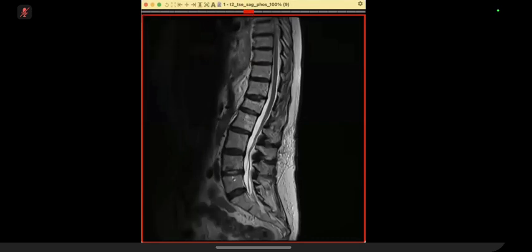I'm worried also about this disc, doctor, because of this abnormal high signal. I'm worried this disc maybe there is some sort of discitis. So I like to review this disc in the T1 weighted images, and if there is a contrast, I like also to see if there is an abnormal enhancement. Okay, I'm checking. Leave the mouse. Okay, you are checking something. Please continue.